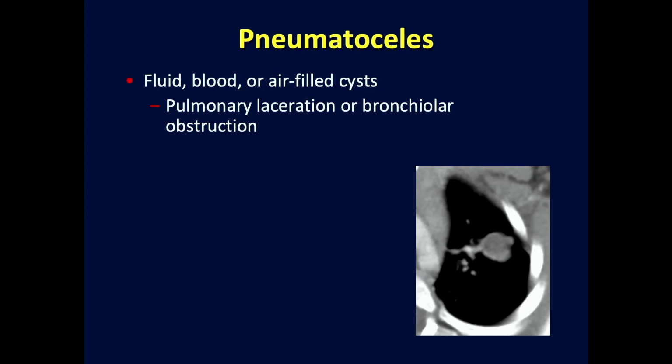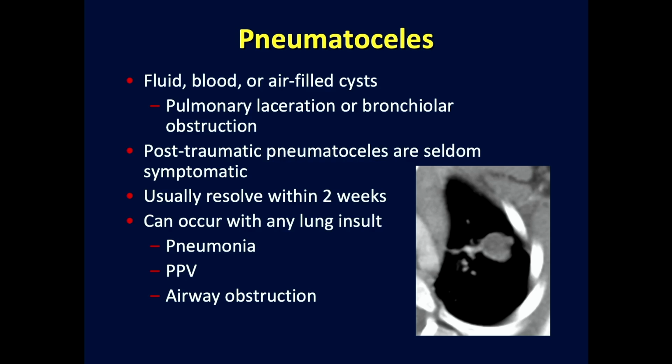So these pneumatoceles are pretty common in children. They may be filled with air, or they may be filled with fluid or blood, and they may be related to a pulmonary laceration or simply to bronchiolar obstruction. And they usually don't cause symptoms, and they're self-limiting. Once again, they don't usually require any kind of intervention.